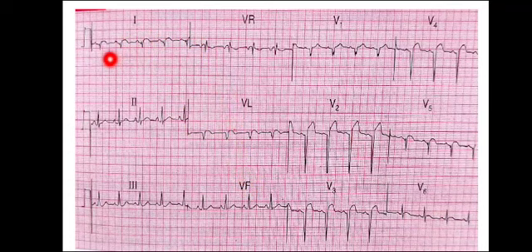After that, we start looking at the PR interval, QRS complexes, ST segment depression or elevation along with T wave abnormality. Here we can see that there is a Q wave in lead 1, and we see whether this is following a vascular pattern or not. In AVL this is also present. So in the limb leads we can see that this is following a vascular pattern, and also in lead V5 there is a Q wave, though this is not present in lead V6.